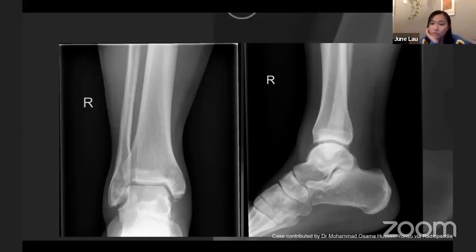So I'll leave this on for a while. And we'll look at our next case.